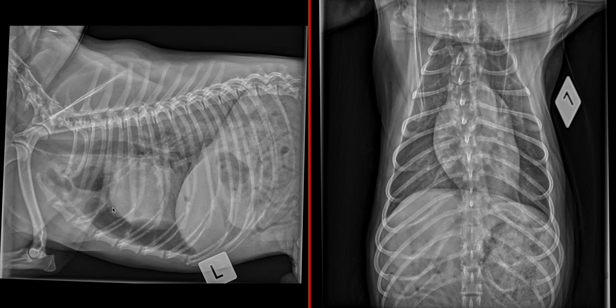We also see irregular stranding of soft tissue in the pleural space. Frequently with pneumothorax, a small volume of hemorrhage can be observed. Since blood can clot, it can also create unusual shapes that don't necessarily follow the typical pattern of the pleural fissures.